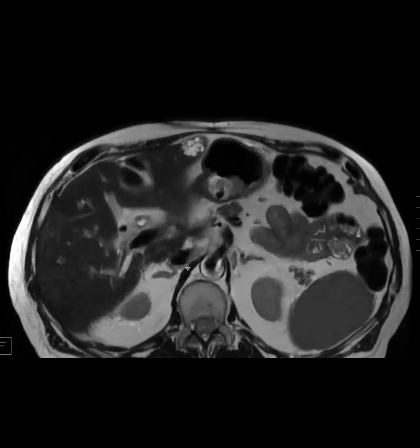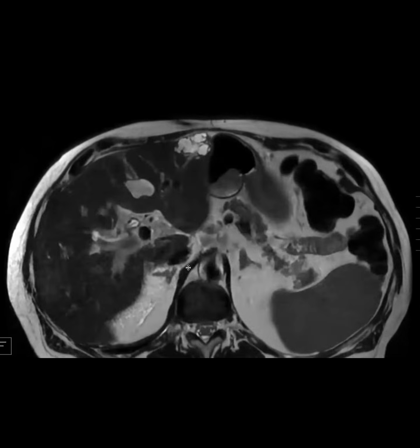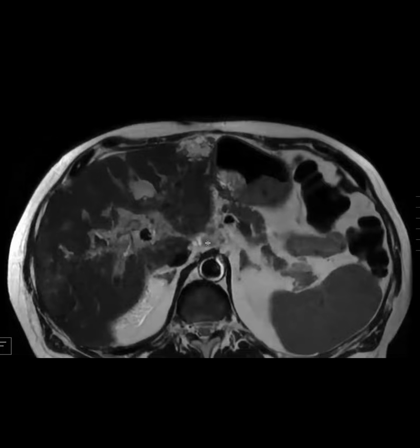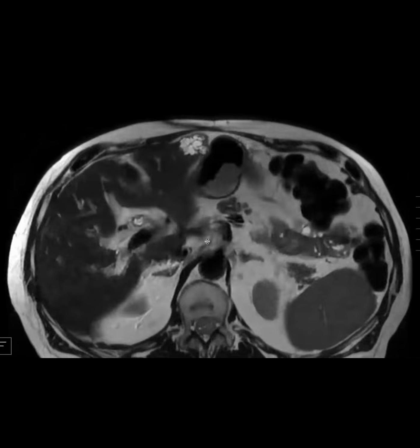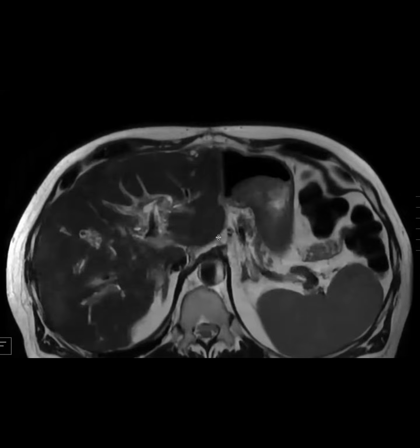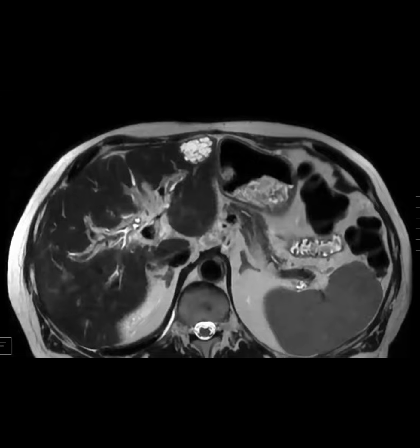When we talk about cystic lesions in the liver, we always talk about IPNB and MCN. I don't think it's an MCN, it looks too multilobulated. With IPNB, you can get the cystic ectatic type versus the intraductal dilation type. This doesn't look like the intraductal dilation type, so I guess it could be a cystic ectatic IPNB. And is there such a thing as a serous adenoma of the liver? I don't know, but sounds good to me.